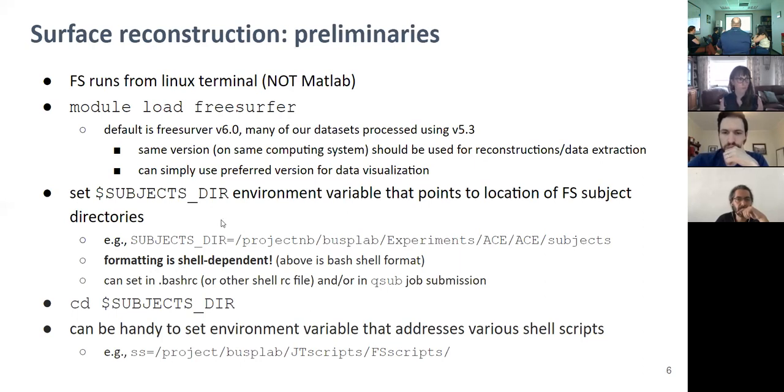In this file, you can do things like set aliases and preferences, and there are a set of preferences that are handy to set. What I at one time would have said is to put module load FreeSurfer there, because I use it so much, and then I could set this environment variable later in the bashrc file. Every time I started a terminal, it would load the FreeSurfer module and set this correctly. But the SCC people have discouraged setting modules. They want you to load modules as you run processes.